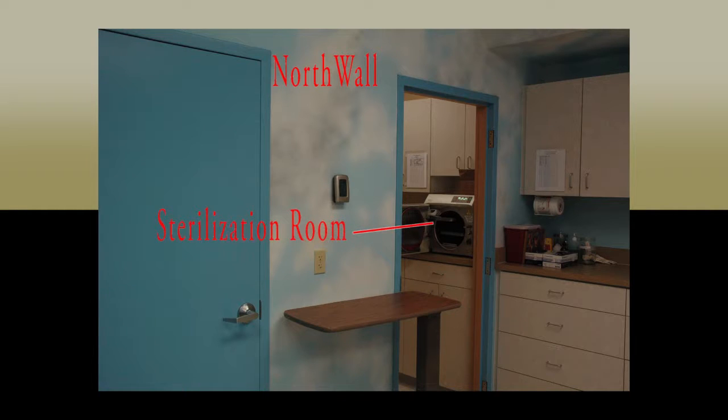outlet that leads to the nurse's station. This is where all instruments that have been cleaned and prepared are sterilized using the steam autoclaves housed in. These techniques are explained in detail in the back office assisting training video under the sterilization section. It is important to note that use of this sterilization room is prohibited during surgical cases.